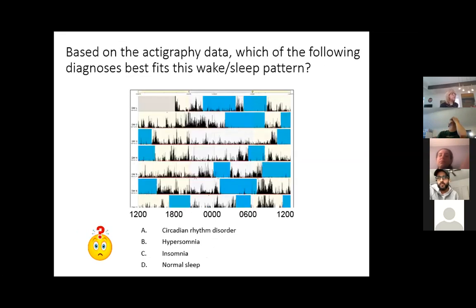All right, ready for more fun? Which of the following diagnoses best fit this pattern? So sometimes the strategy for board exams is read all the answers and then imagine what the actigraph would look like. That's a big clue. So generally, look at the diagnoses.